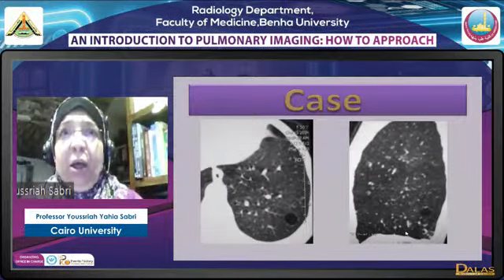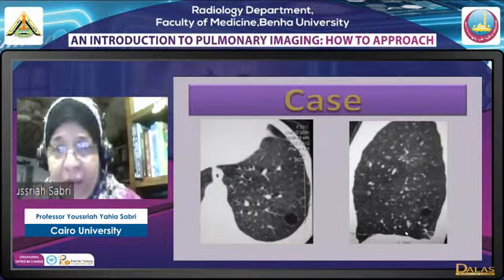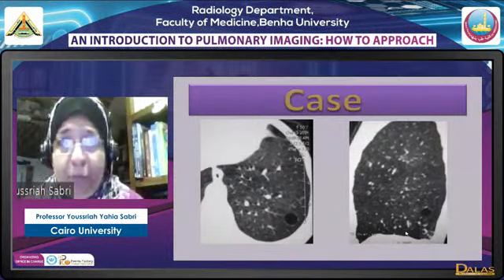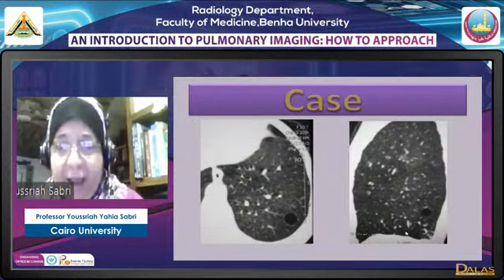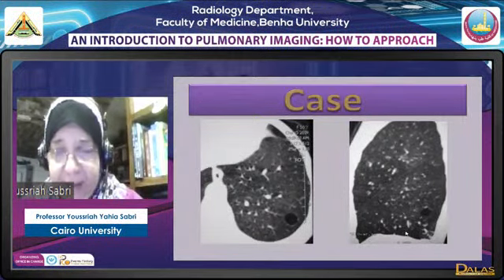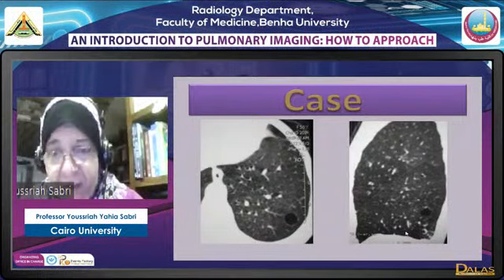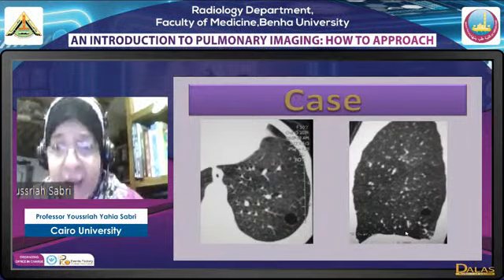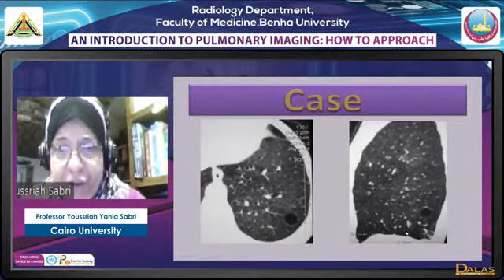What is the possibility? Well, actually, there are congenital causes, traumatic causes, inflammatory causes. There are so many causes. Unless you have a definite history or previous film, this is just an air-containing cyst. You measure it, and you say, where is this? Could the lung's air-containing cyst be congenital? Yes. A bronchogenic cyst in 15% of cases can be a solitary lung cyst, and it will be air-containing, not like the mediastinum where it is fluid-containing. Okay? So a bronchogenic cyst could be congenital.